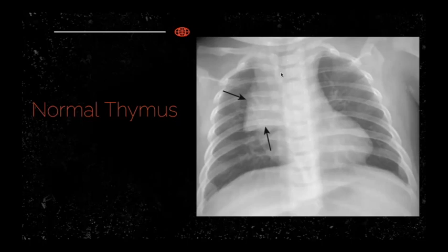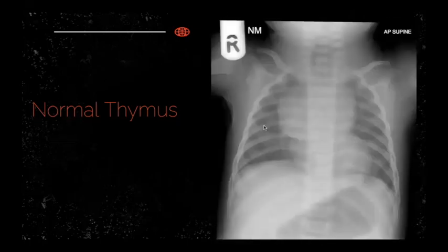You can see that the airway, the trachea, is still patent. It's a bit rotated, but the trachea is patent. No mass effect from this opacity. Right, so this is another radiograph showing a normal thymus. We can see the very sharp border laterally, and the airway, if we scrutinize further, we can change the windowing here, we can still appreciate a normal airway. And then the lung is very well aerated. So basically there are no secondary signs of any mass effect onto the airway.